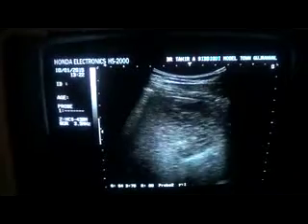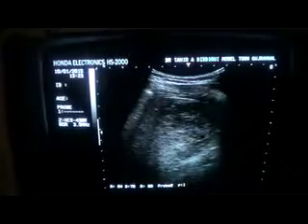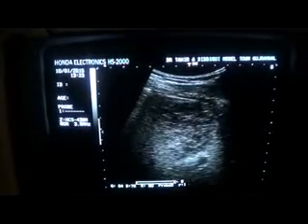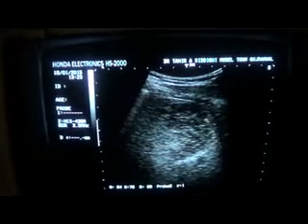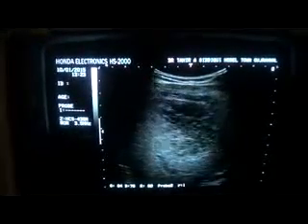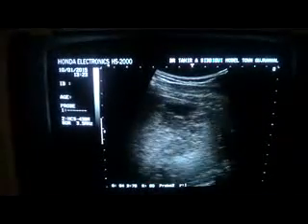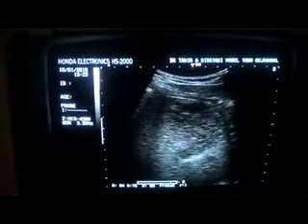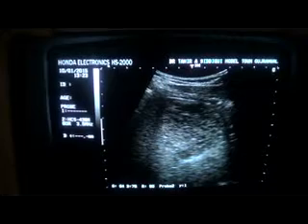Now this is a bit magnified view of the same. No internal calcification is seen, and this picture is very much typical of a liver abscess in healing phase, because you see the posterior wall enhancement, an almost regular, relatively thin wall, and it does not fit into the category of any other focal lesion seen in the liver. So this is how we report about that.